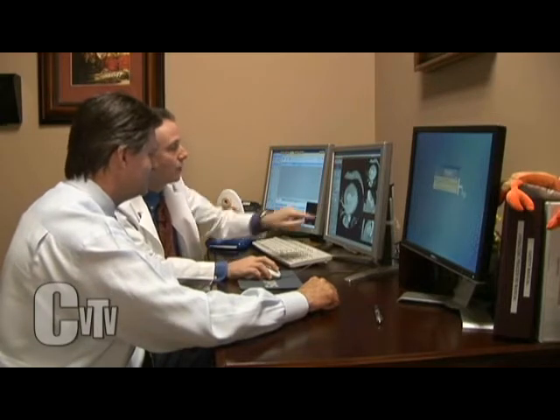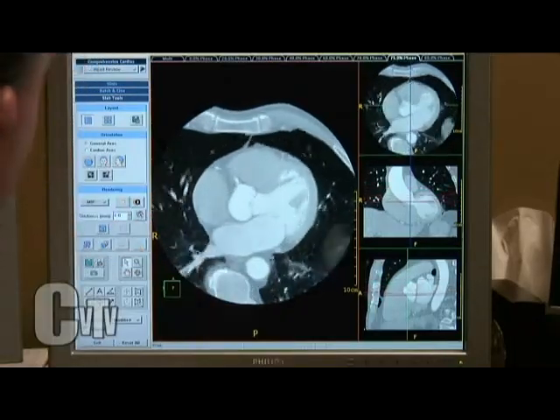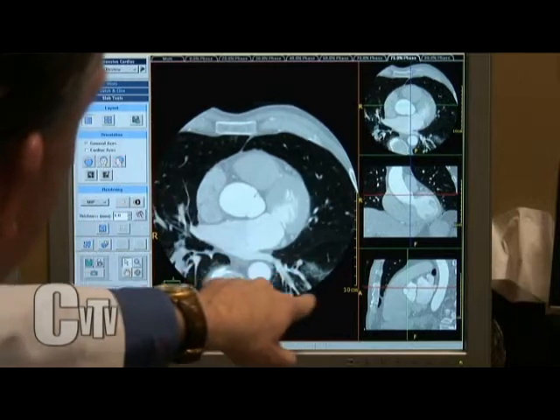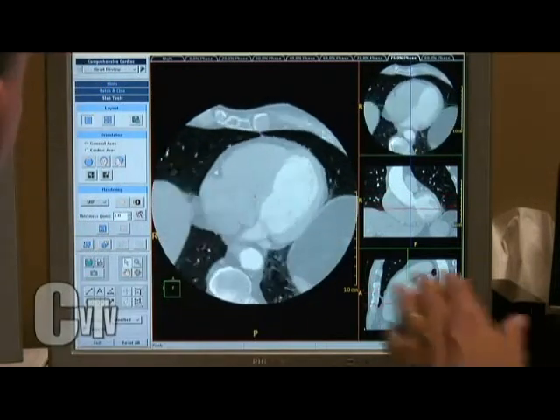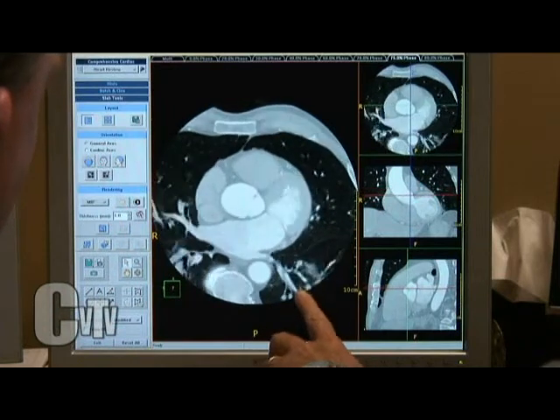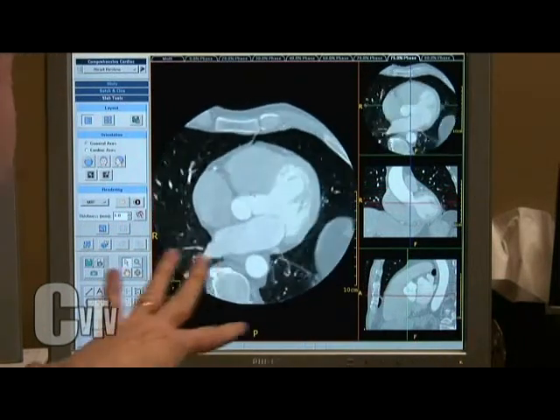Wow, what a deal. So let's look at the lungs here. Right lung here, left lung here. Now this is a different person. This is not you. But here we can see there's some scarring down here of the lung. Not unusual or atypical. The scarring appears as white. The lung is usually black, right, and if you get this scarring right in here, you're looking at the white, and that tells you that it's thicker tissue. Right. Okay. Not terribly unusual.